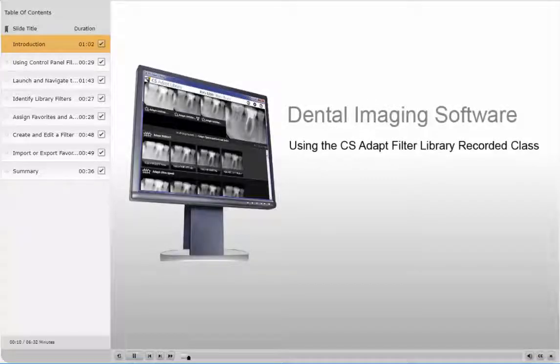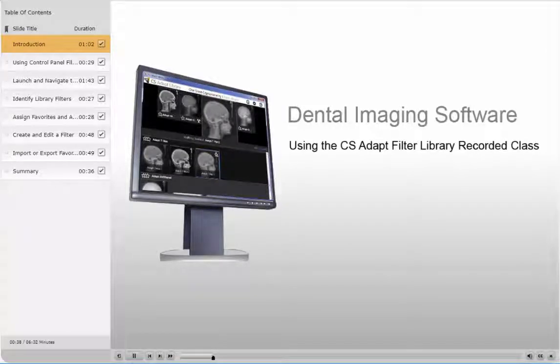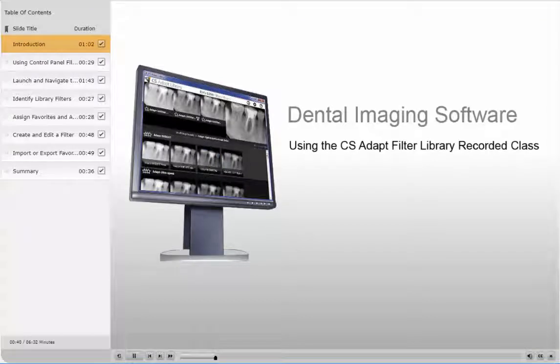Dental imaging software using the CS-Adapt filter library recorded class. This recorded class is designed for clinical team members. It provides instruction on using the CS-Adapt filter library with the 8100 series, 9000 series, and 9300 series X-ray units, and the 6200 RVG. The Adapt filter library can optimize image contrast for 2D Panoramic, Cephalometric, and 6200 RVG exams, according to user needs and preferences.